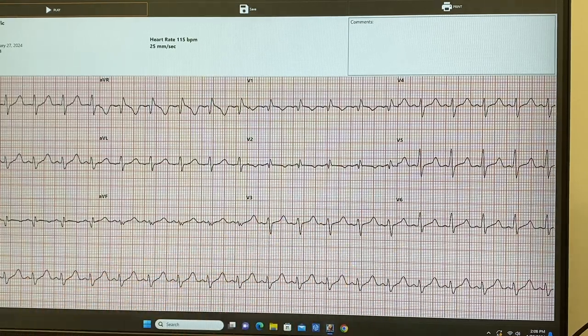And there is. Are they normal looking P waves? Yes, they're one square on each side of the grid marks. So they're normal looking P waves, and there's 1 P for every QRS since you marched them out already. Yes. Okay, good.